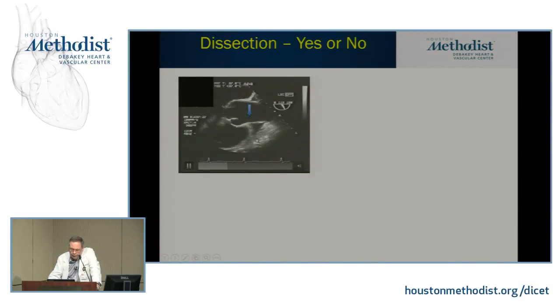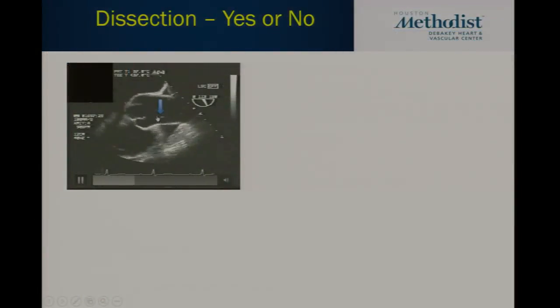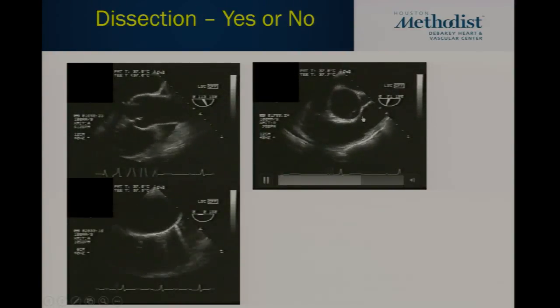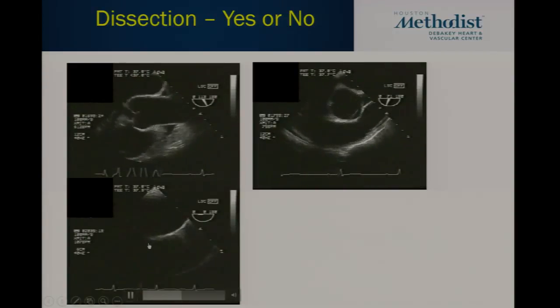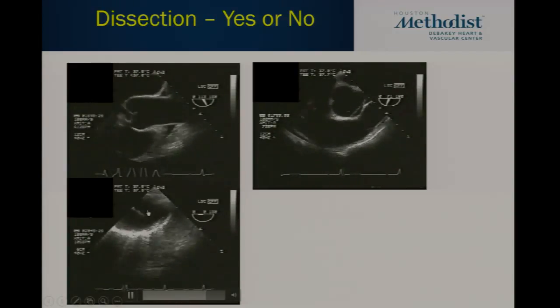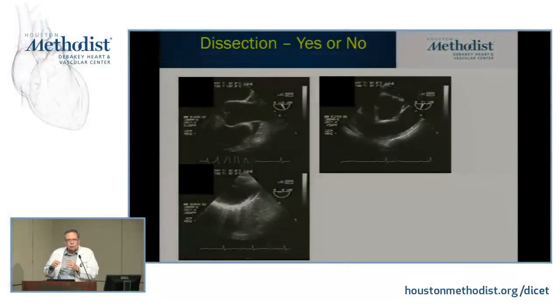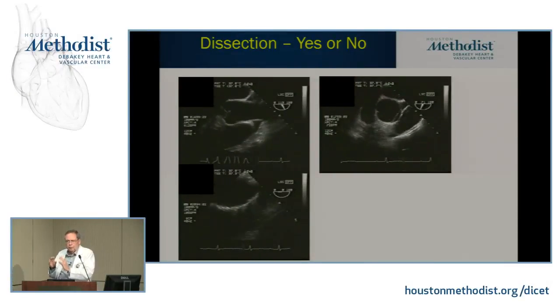Look at this one. This is very subtle in this view, very subtle. But if you can see it, it has a movement of its own. And when you see it on this view, it's more convincing. Look at that. See, that's a movement of its own. And now we even start catching right there. So actually, this was a type 2. Okay? So it's not how bright, how brilliant it looks. It's other features. Mobility, particularly mobility.